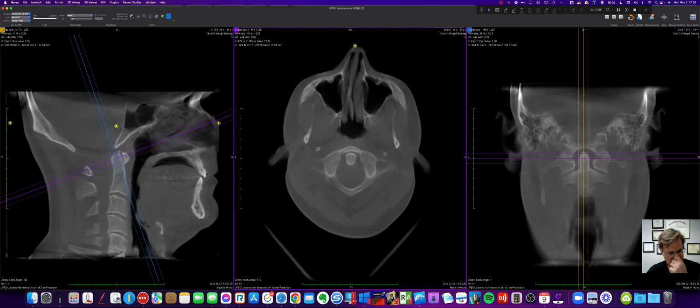So how are we going to find this? Well, to use Dr. Blair's protocol, which, as I said, may not be the best, is we're going to put a dot in there. And then he would find where the foramen magnum would overlay the lateral mass here. Well, a lot of doctors have found that this point here seems to be okay. I'm not too comfortable with that at this point. We need to do some more tests because I think we're going to find that with all the things that he couldn't do that we can, this is probably not the best way to find it. And we're going to hit that out there.